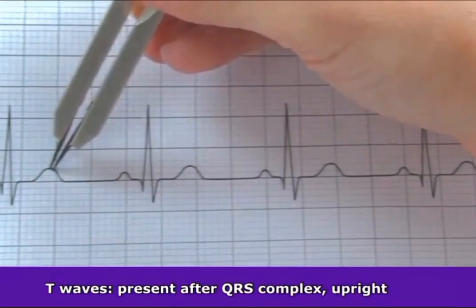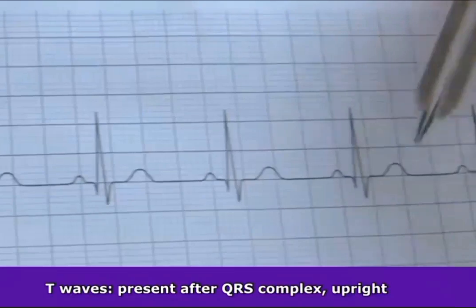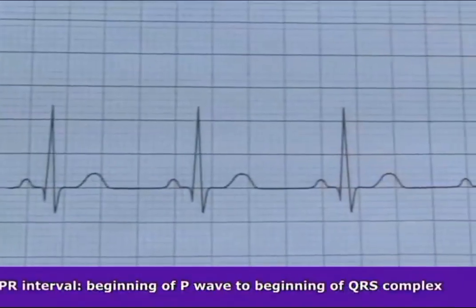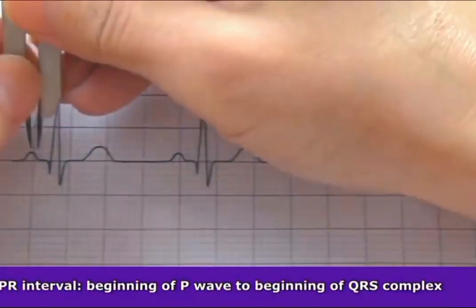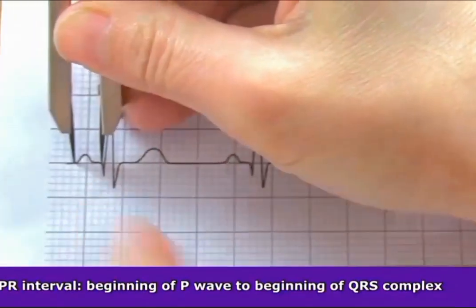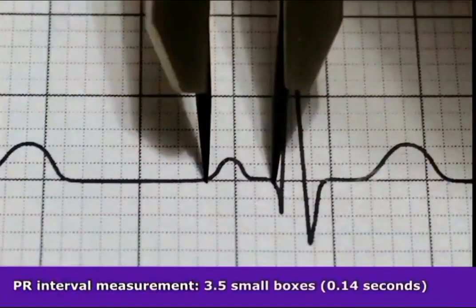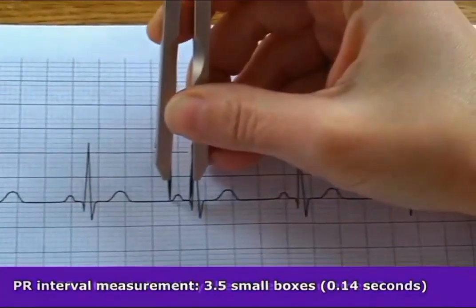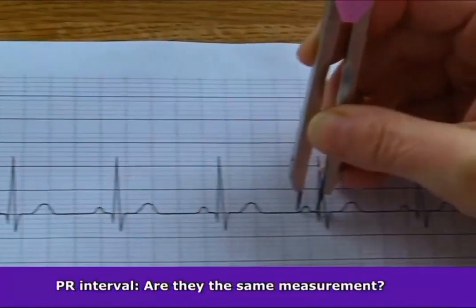Then look at the T waves. Make sure there's a T wave present after every QRS complex and that it looks like a T wave. It's where it's supposed to be. It's upright. And then lastly, we want to look at the extras. So let's look at that PR interval. And again, you measure that by going at the beginning of the P wave to the beginning of the QRS complex and measure out the boxes. Here we have about 3.5 boxes, so it's 0.14 seconds. And then you just want to go throughout your strip and you just want to measure that and make sure that all your PR intervals line up to be that same measurement.